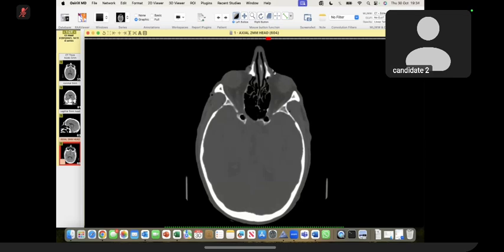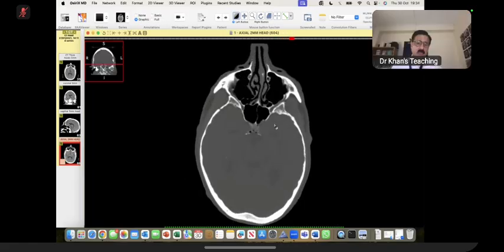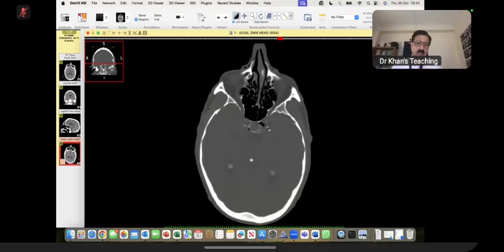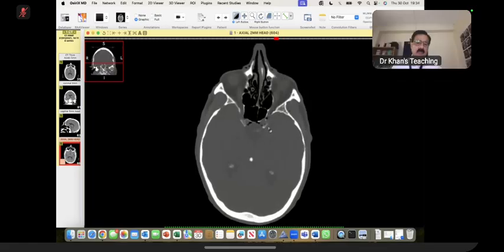And sir, a few small air foci are also appreciated in the bilateral soft tissues of the temporal lobe. So I think you have pointed out this air. So where is this air, anatomically speaking? Yes, sir, over here. I am asking you anatomically, where is this air?